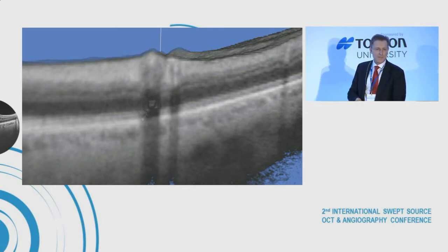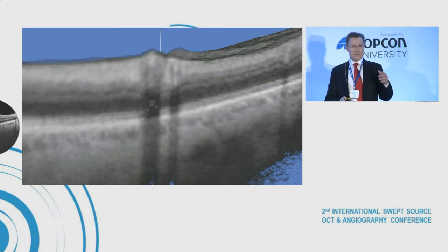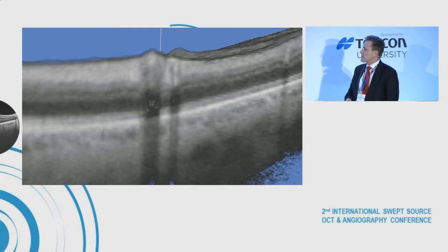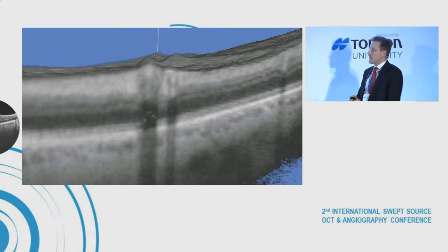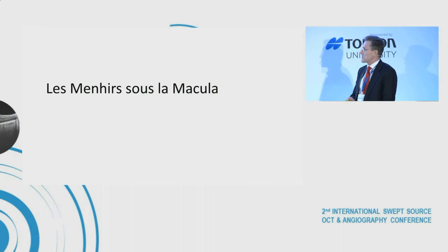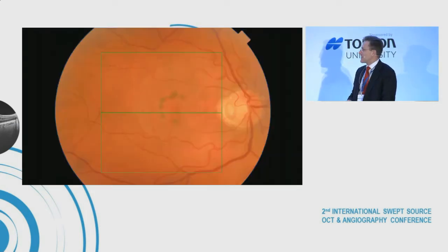It's a good sign because the reflectivity of the blood is high when you have blood that is flowing. If it comes to a standstill, then the reflectivity will go down, and you can diagnose conditions such as ocular ischemic syndrome.